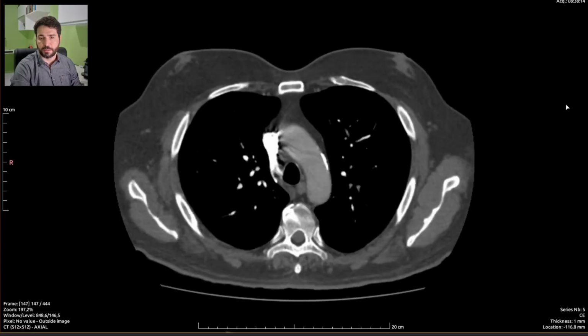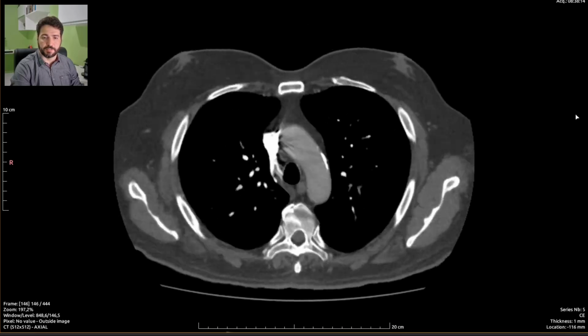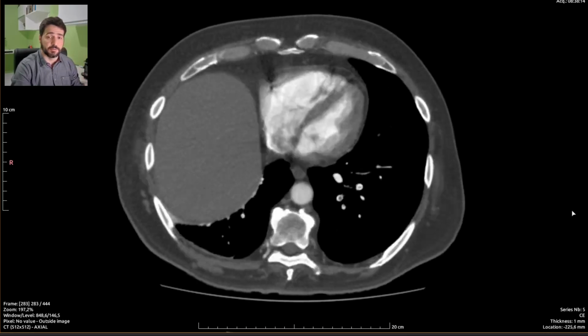So let's be quick. Let's report it as fast as we can as a very, very severe case of acute pulmonary thrombosis.